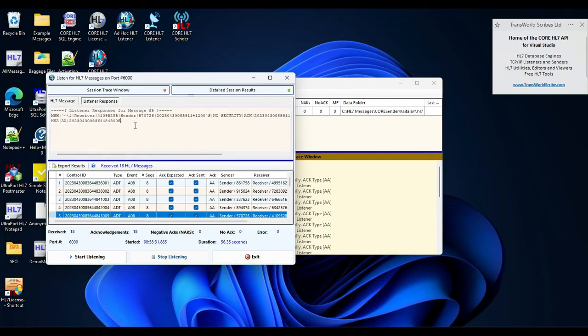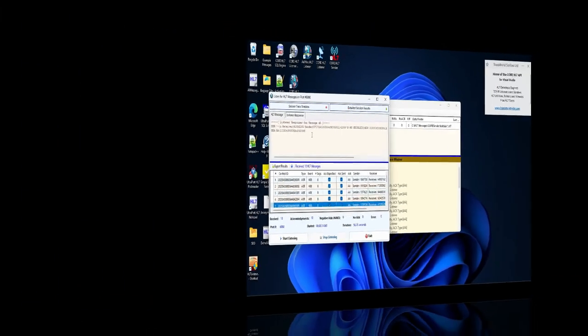For the next step, we're going to need to first buy a license, then apply that license, and then we'll install the Windows services, make sure that that service works properly, and once we've done all that, we'll be able to send to a remote listener and test that.